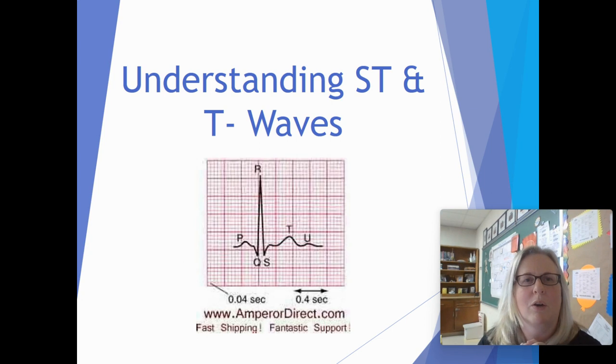Last week we talked about ischemia and infarctions, and we learned that ST segments and T waves play into a big understanding of what all that is. We had ST elevation, meant that there was a STEMI or a myocardial infarction, and then we had some ST segment depression that mimicked ischemia, so that was just the narrowing of the blood vessels. So there's a little bit more to understand.